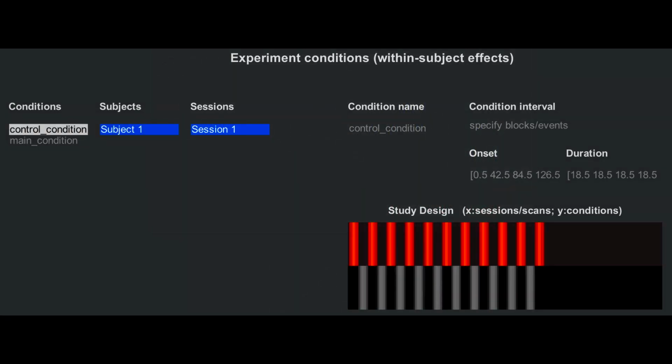When we get to GPPIs, the practical section a little bit later, this is basically what it will look like. And this is where BIDS format really shines, because if all the timing files are in BIDS format, you simply click a button to import it, and it will automatically assign all the onsets to the right conditions. Again, I've tried to break it, I've tried to fool it. As long as the basic terminology is consistent across the subject, so sub-01, sub-02, and the anat and func directories, it will correctly match everything up.